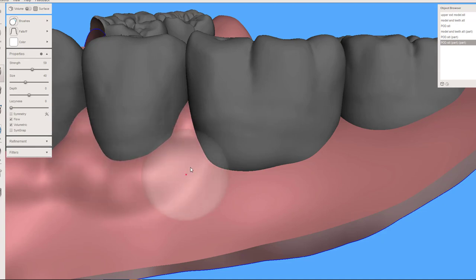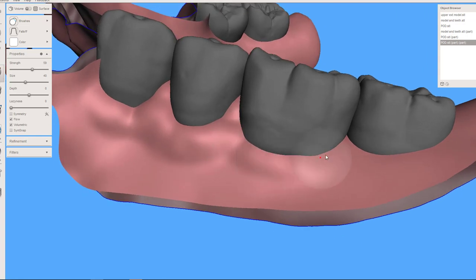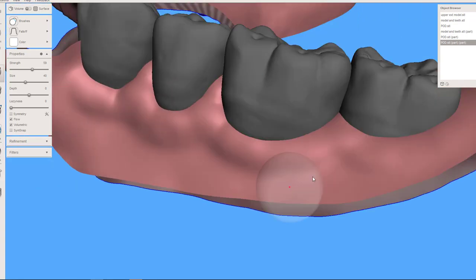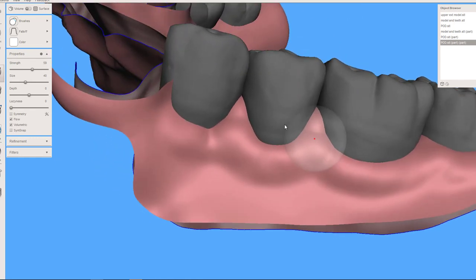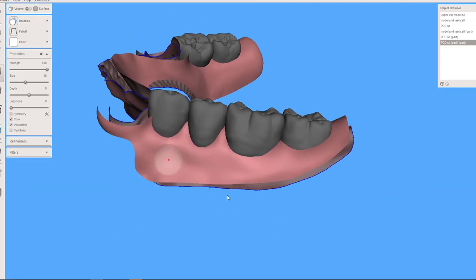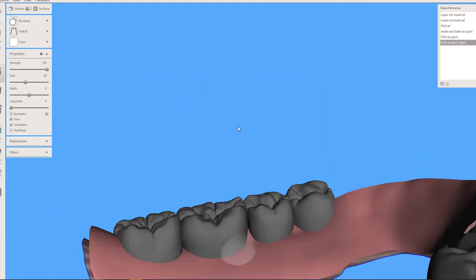So I'm just festooning here. I don't have to, like with a conventional denture tooth, worry a lot more about getting lots of that tooth covered so that it doesn't end up popping out or something. But here, you're going to print this tooth in a very similar resin to the base itself. So those things bond really well, and I don't get too worried about trying to make the necks of the teeth be completely covered. There's a lot of ways that we can remedy that, and the bonding is just better.